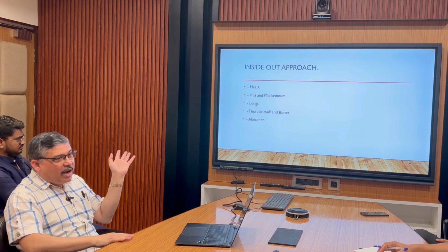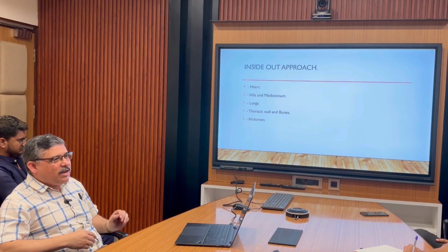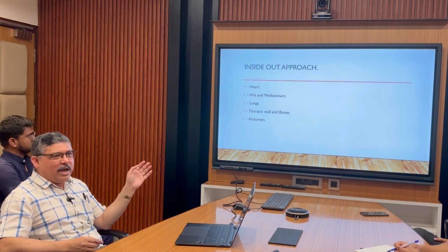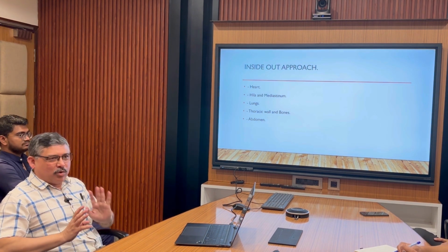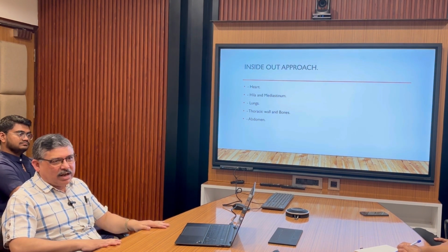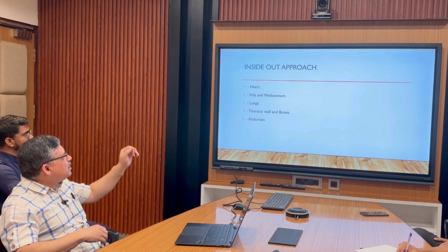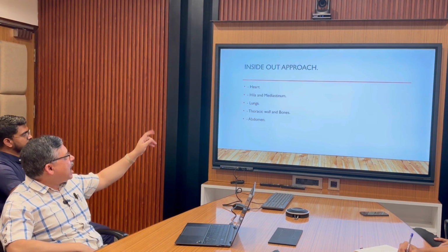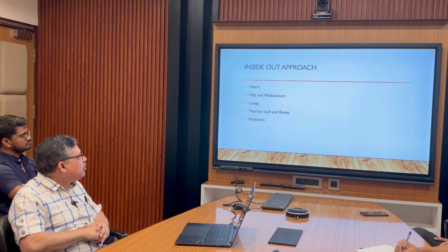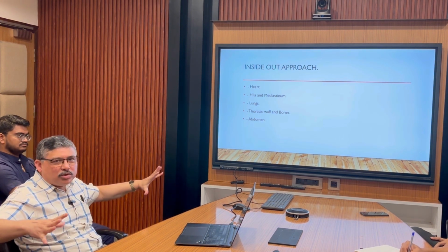So, how do we see an X-ray? There are basically two approaches. One is known as an inside out approach. One is known as an ABCDE approach. Whichever you do, you don't try to miss out things, otherwise you will tend to miss out a few things. So, what is an inside out approach? You see the heart, you see the hila and mediastinum, you see the lung, you see the thoracic wall and the bones, and the abdomen. So, this is the inside out approach.